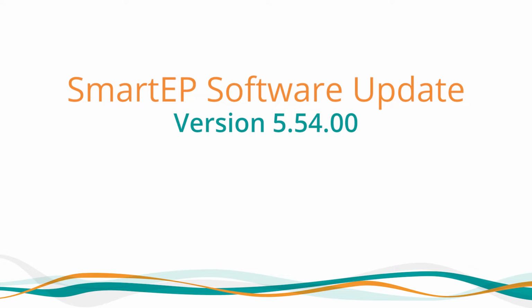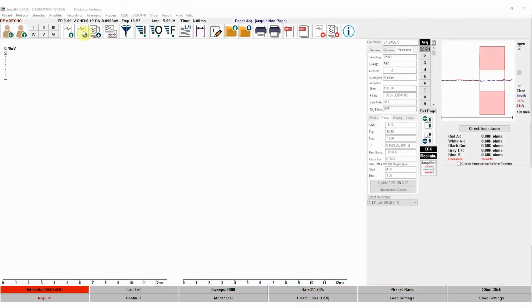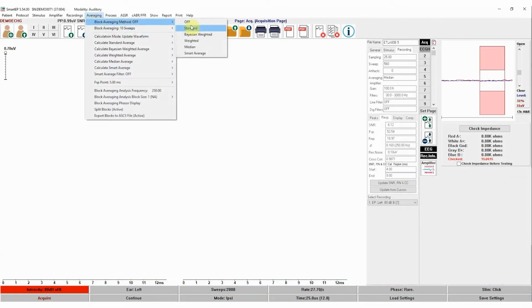This video will review updated features for the SmartEP version 5.54. IHS has implemented live averaging for weighted, median, smart average, and the new Bayesian weighted averaging methods. Let me show you how it works.